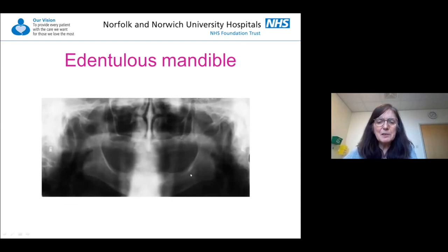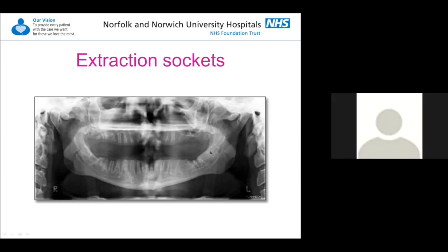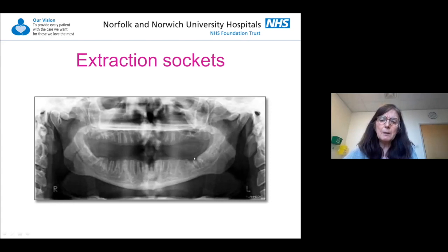I've put this in as an edentulous mandible. Teeth are gone, basal bone here, nothing very remarkable about that. These are extraction sockets. So this patient's had a dental clearance, and if you see someone with sepsis who's had a recent clearance, look in the sockets to make sure that they are clear, that there aren't any pieces of residual root left behind which can cause infection.